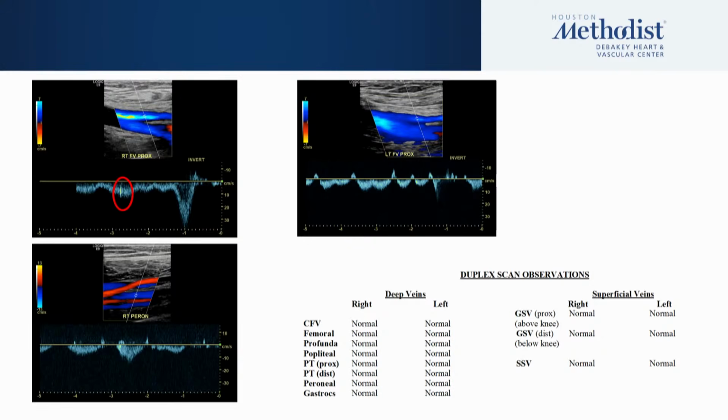The patient had a small pulmonary embolus, I believe, and on the ultrasound they didn't discover any significant major deep vein thrombosis, but during scanning he was able to catch this microembolic signal there, suggestive of a remnant of some thrombus still present in one of the vessels in the lower legs.